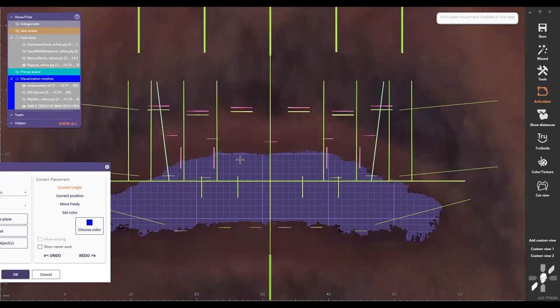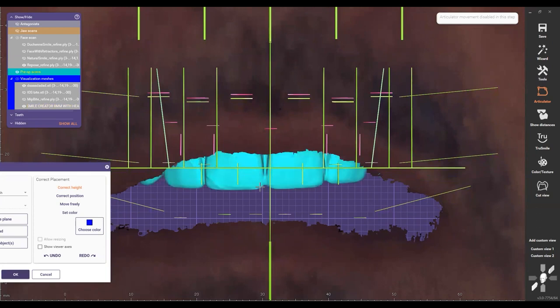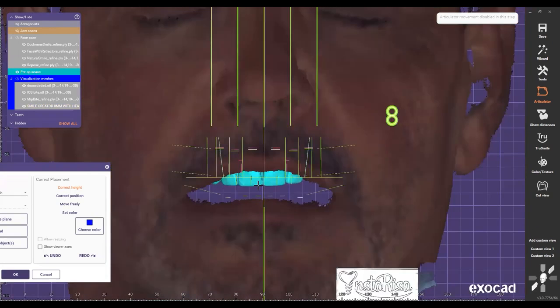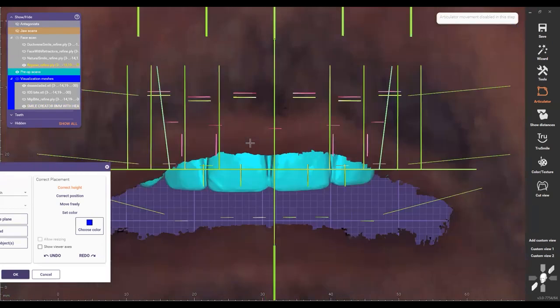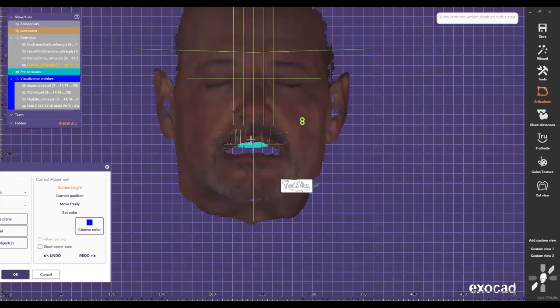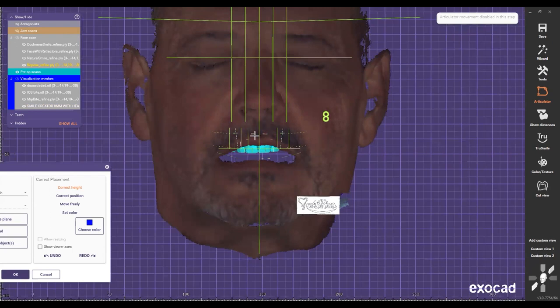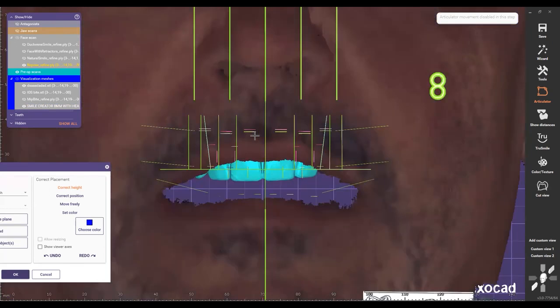Each square in the background is 1 millimeter. So that tells me that my new incisor position is going to be just right there. That means I will have to make this incisor a little shorter, based on this. But not only that, I have to consider that this patient is probably 50, 55, still young, right? The muscle of the lip is there. If it's a 70, 80, 90 year old, then I wouldn't focus too much on the repose. I would focus more on the Duchenne smile.